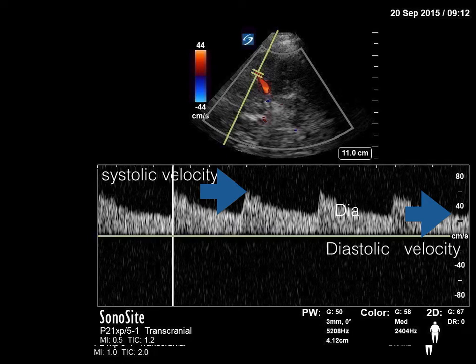be diagnosed and predicted. Now let's see, normally the systolic peak is around 60 to 100 for a normal adult. Now what will happen in case of subarachnoid hemorrhage? This flow velocity will increase to a limit. Can you guess? It will be more than 200, 250 centimeters per second. Here it is 70, right? When there is vasospasm, the same amount of blood will flow through a narrow vessel with a very high velocity. Now this is number one.